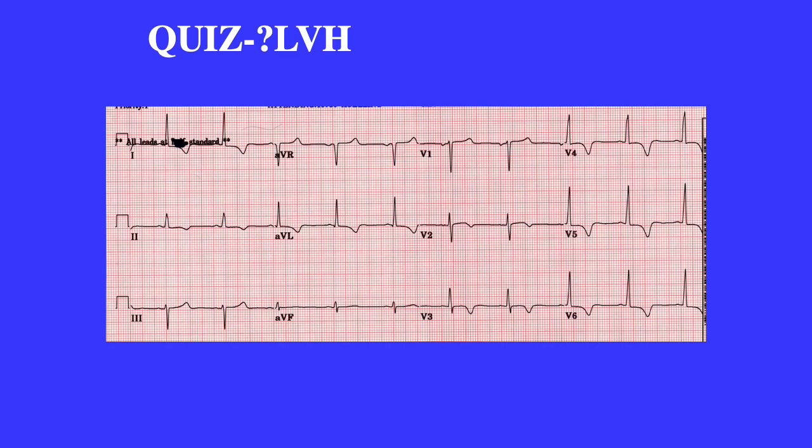I'll give you all 30 seconds to look at this EKG and let me know.